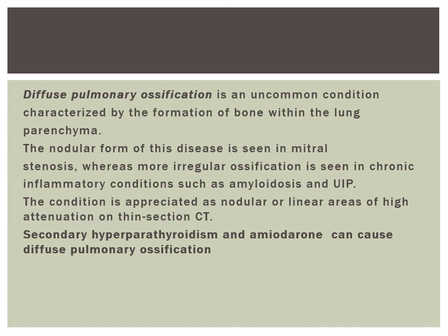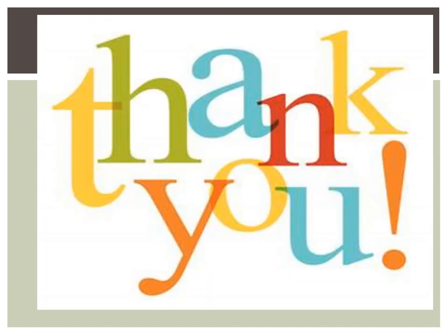If you do the image without contrast, you see the image as if there is contrast. Okay? Thank you.